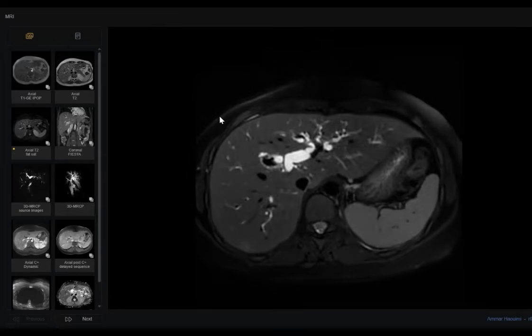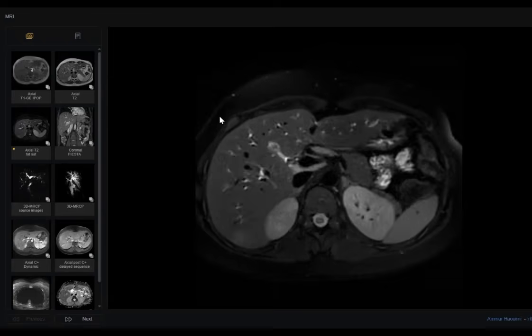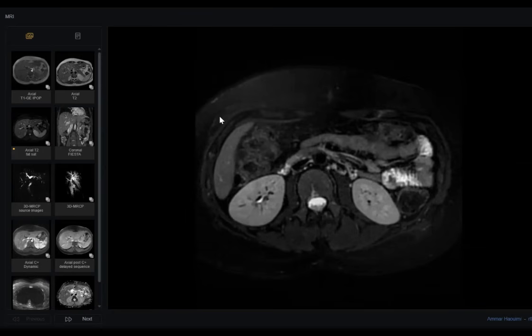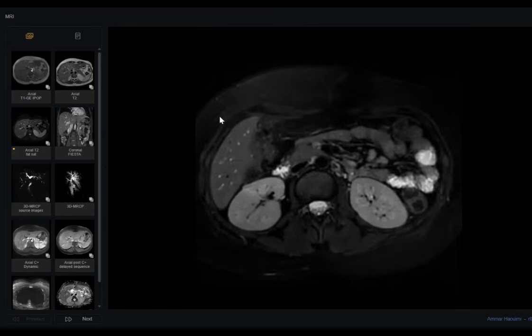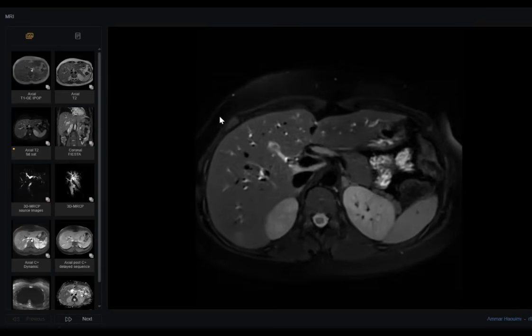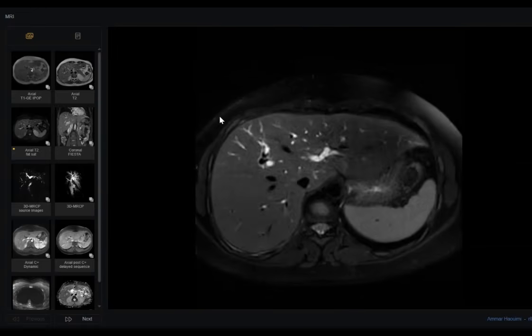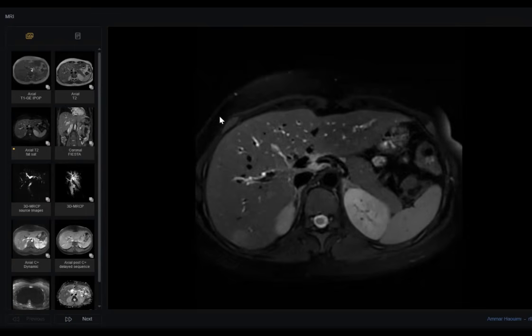Obstructive jaundice, post surgical. These are T2-weighted MRI images of a female, FAT-SAT images of a patient who has presented with obstructive jaundice. The cholecystectomy has been done. So now I'm looking at the intrahepatic biliary radicals. I noticed that there is dilatation of intrahepatic biliary radicals.